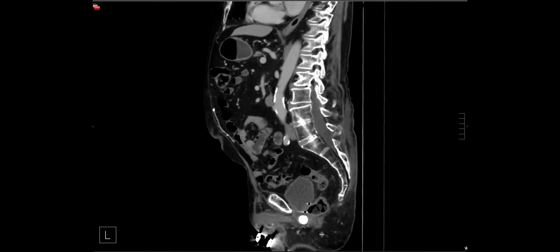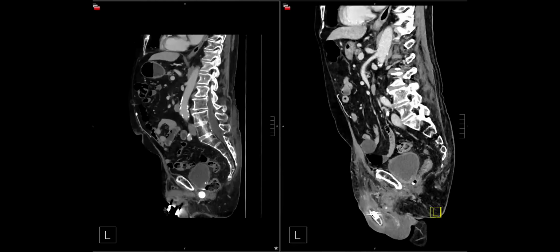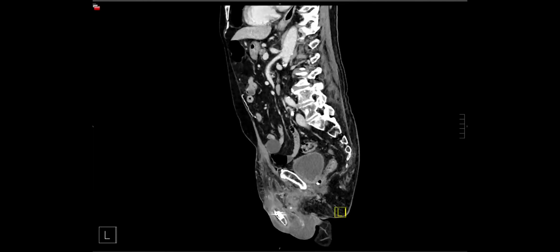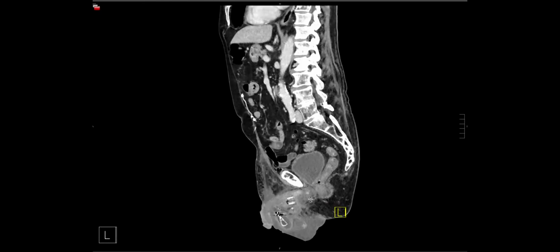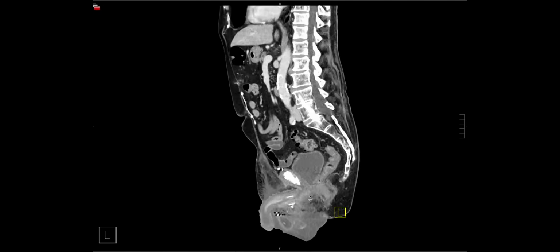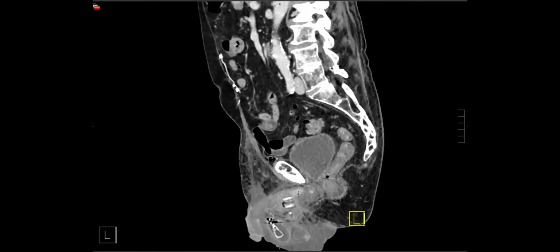I've never seen it before, but is it some kind of new prosthesis? Yeah, so the patient, go ahead. You want to fill that space so that it does not get either hernia or infection, or just bulking agents?